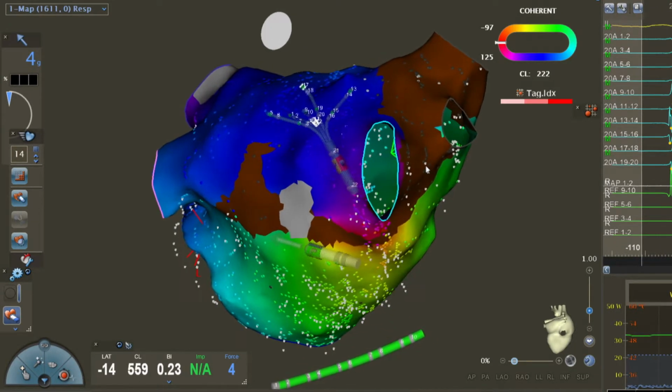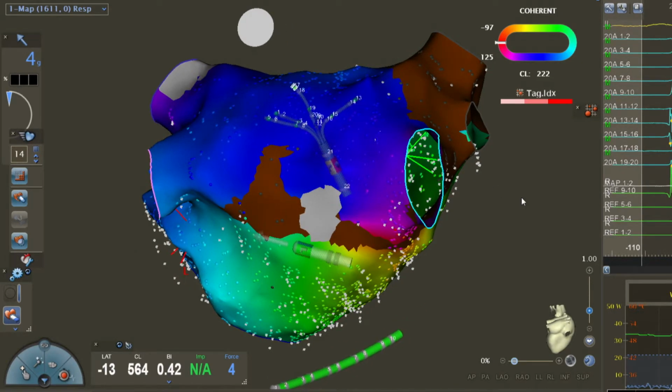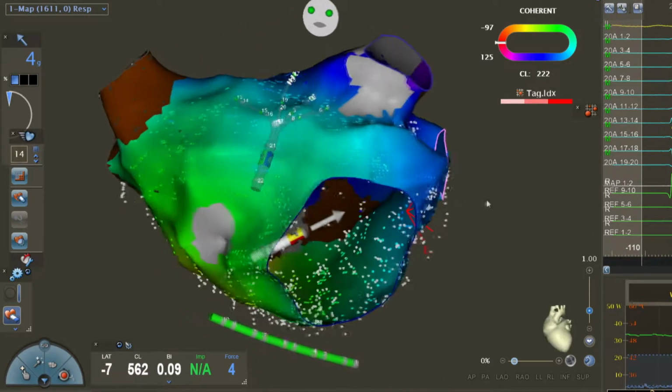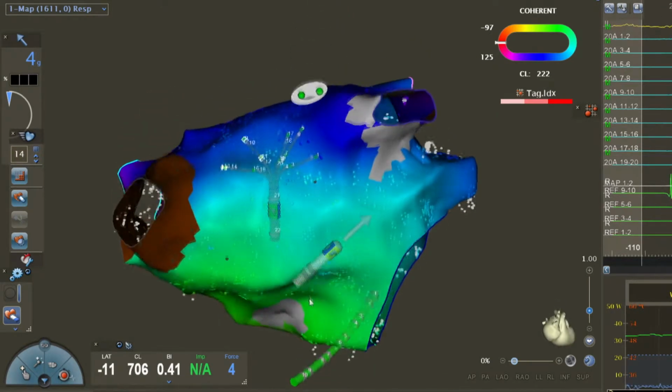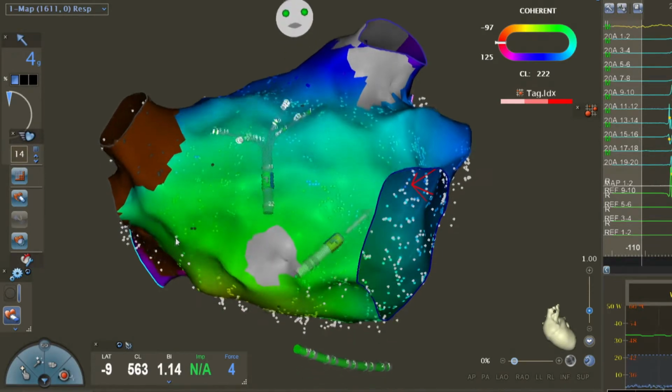If the vector of propagation goes around some area, this area should be a non-conductive tissue, otherwise, the activation should go through this area. In this example, we have significantly slow conduction across the inferior connecting line, while in the roof area there is not even conduction slowing.